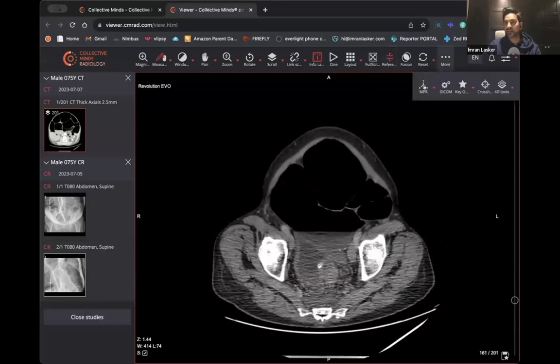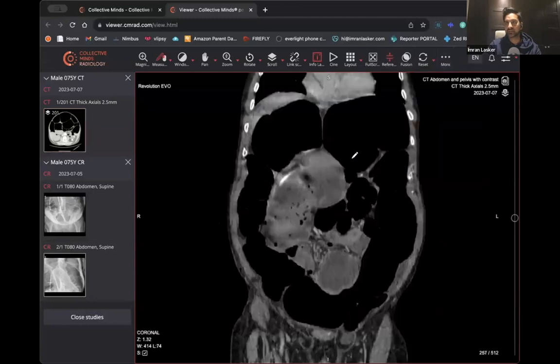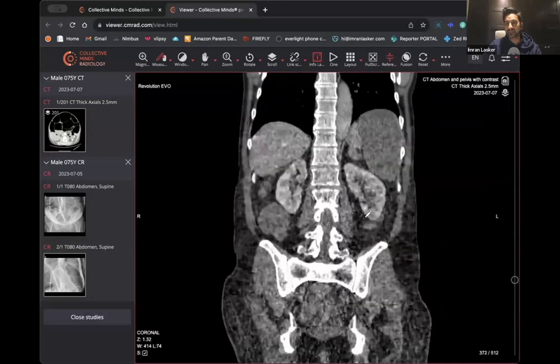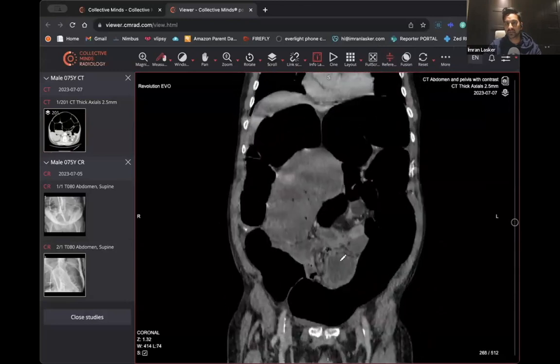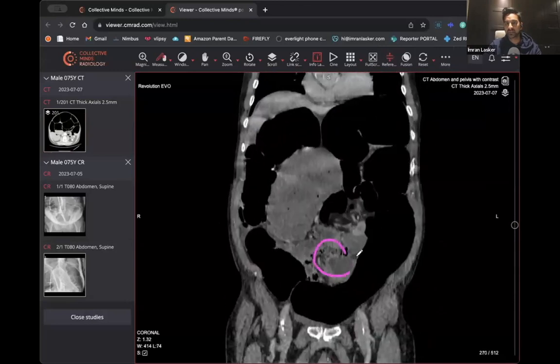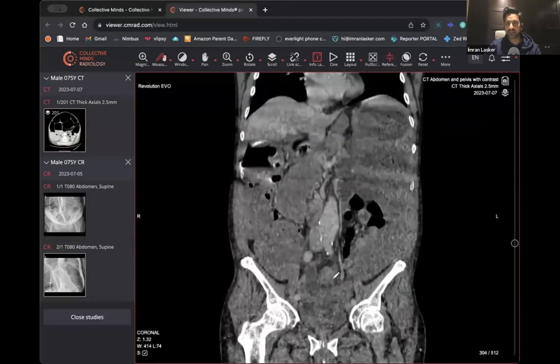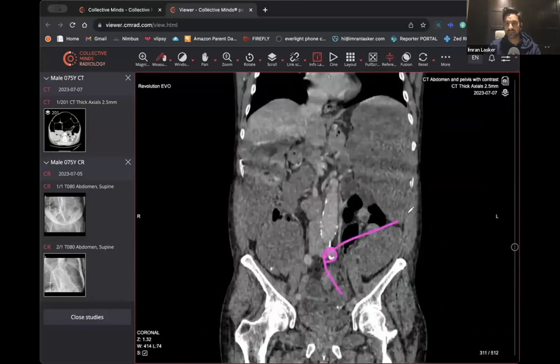And the best way to do that is probably just to use the MPRs. As you scroll through, hopefully this works, you'll see a little twisting of the bowel. So if you keep your eyes over in this area over here, can you see that? What I'll do is go forwards and backwards, and you can see the twist. You see it do like this and like that, right?